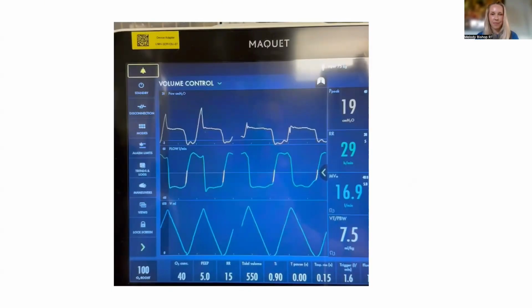Back to the normal physiology, which is interesting: we breathe in response to CO2. If there's some process causing more acidosis, we're going to breathe harder and faster to breathe off that CO2, at least in the short term, as our kidneys gear up. But if we have kidney injury, we can't do that because they're not working. So that becomes a whole other issue. Anyway, this is horrendous. This certainly should show you that the peak airway pressure, while it should be higher than the plateau pressure in volume control, is not always true, especially if the patient is working tremendously on the ventilator.